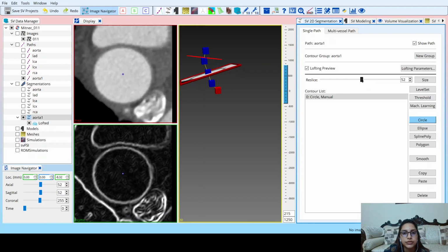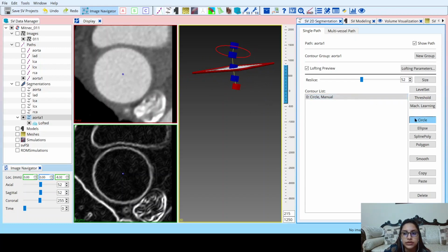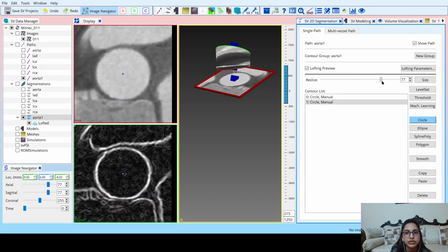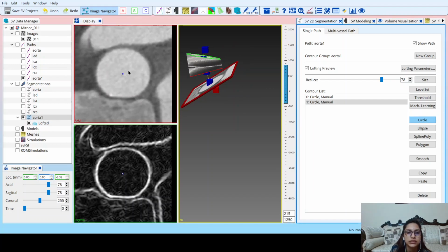54, 52. Now we can see the second contour will be created and it won't overlap. So let's put a point there, and that's it. Then moving on. This is the part for the segmentation. Again, just check if it's not overlapping and create a circle.